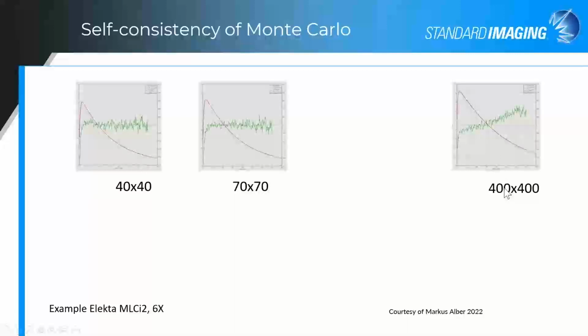But then if one looks here at the 40 by 40 field, the agreement isn't as good. You have some under prediction here at the top, over prediction here at the bottom. So what's going on here? Is this a measurement error? Or have we selected the wrong spectra, for example? And you can see here clearly in the 10 by 10 field, there is not good agreement.